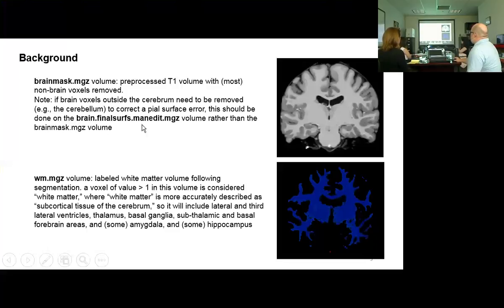So there's this other brain volume just for that one special case where you would edit these. So when you erase something from this, it is erased from what FreeSurfer will consider cortex, but it won't erase it from the brain itself. So there's another segmentation step that really isn't all that relevant here, but where you get a cerebellum, you don't want to delete those voxels, so you use this by editing here. They'll remain for that segmented area.